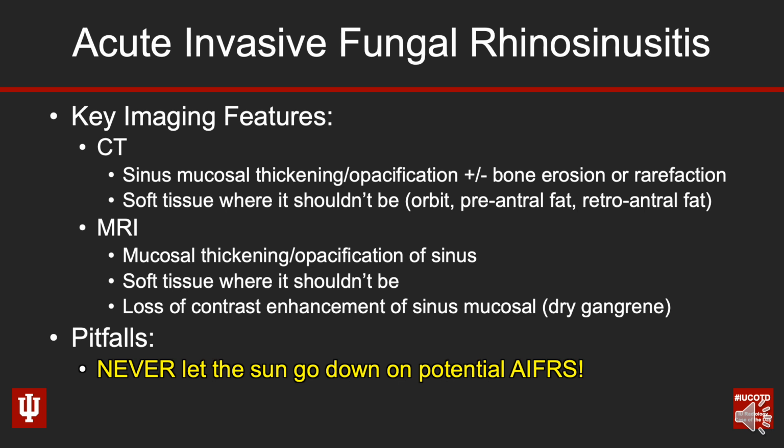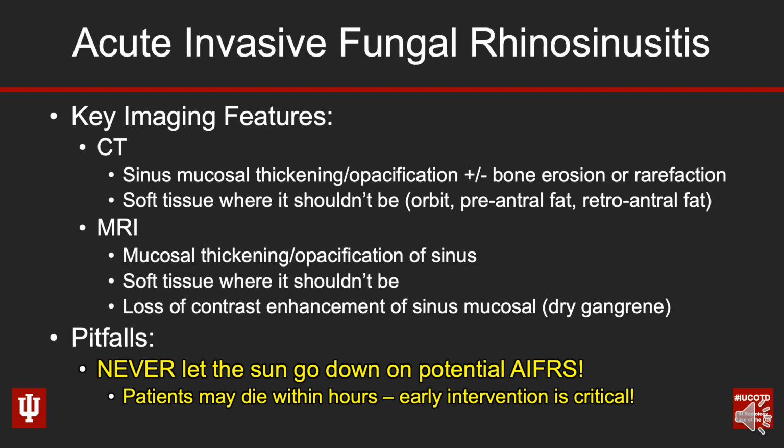And as I said, if you see these findings that are suggestive of it, before you ever sit down to dictate, get on the phone, communicate those findings right out of the gate to the referring doc, because these patients need urgent surgical debridement, and they may, for surgical planning, end up needing an MRI if it can be done as quick as possible. But I want to stress, patients can die. Patients oftentimes die of this diagnosis, and they can die within hours. So early intervention is absolutely critical in these patients.